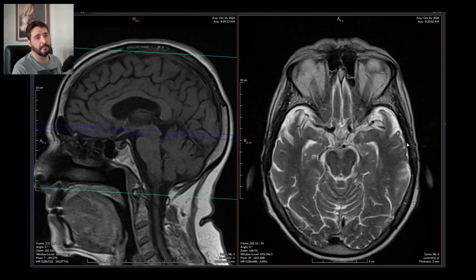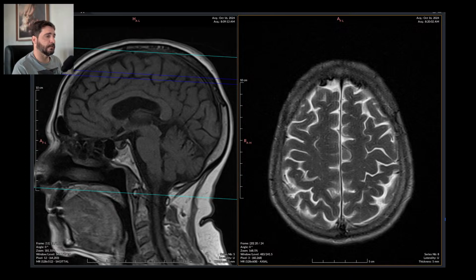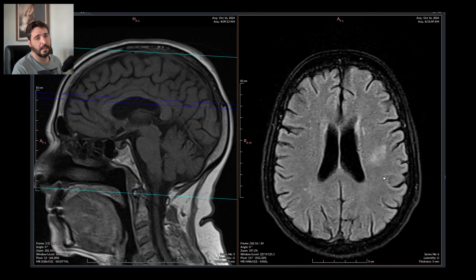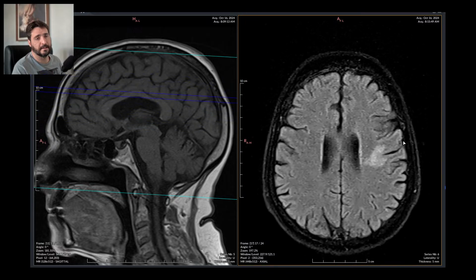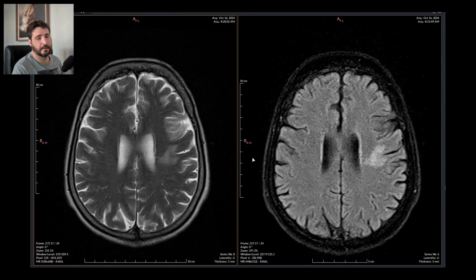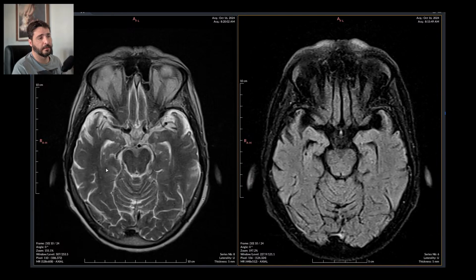So cerebellum and brainstem are fine. Thalamus also. T2 is fine. Let's grab a FLAIR. This is a T2 sequence with an additional pulse to saturate normal brain fluid, and this is really noisy. This is bad. There is some gliotic site right there. Let's compare it to the T2. Yes, gliosis for some reason. Let's just not hope. Yes, it's there.